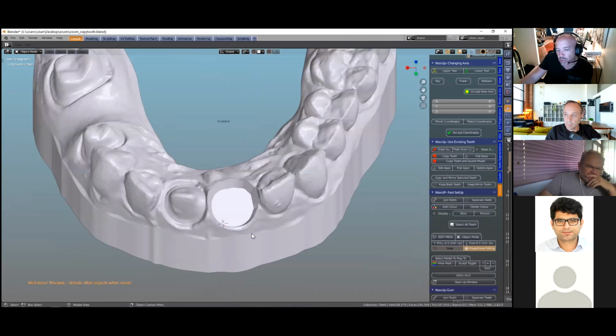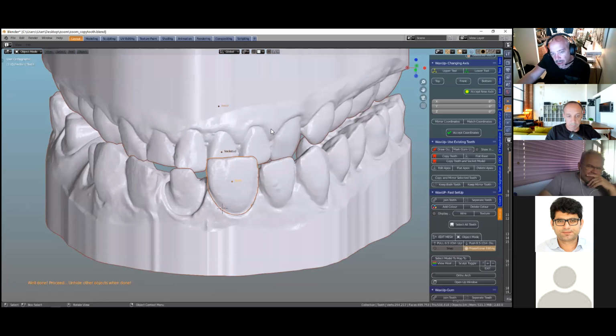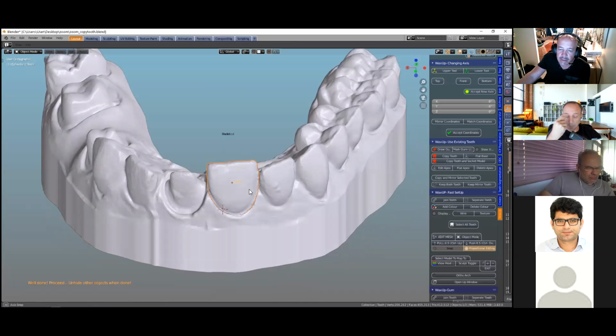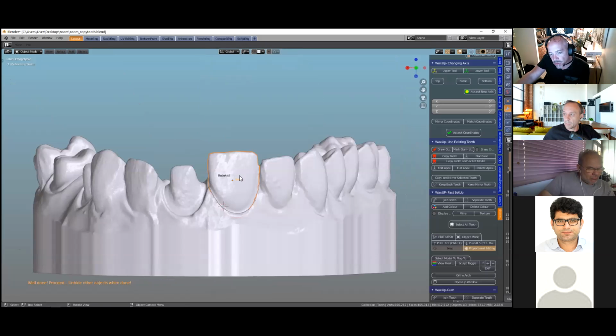So if you want to remove 4 or 6 front teeth, you can then socket the model, and then you would then obviously take this specific one and use the splint module and then join this tooth to the layer. So we can think of making partial dentures, for example. Okay.